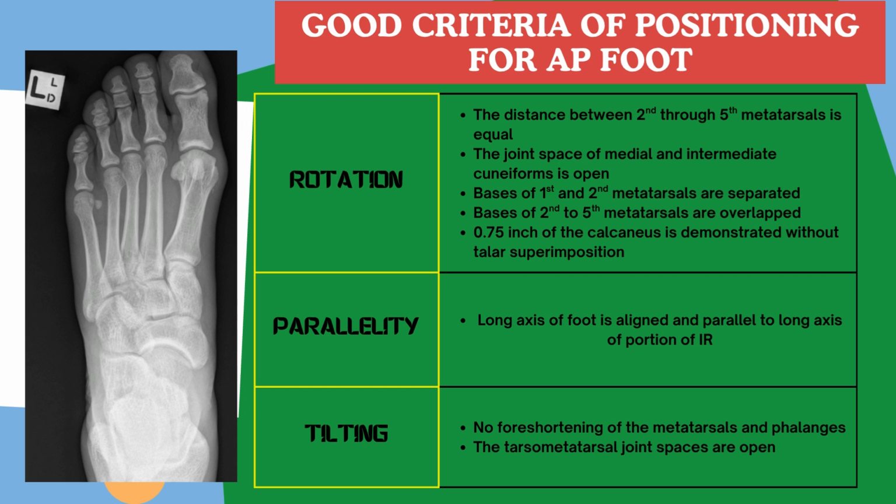The next component is parallelity. To prove the radiograph is parallel with the IR, we need to make sure long axis of foot is aligned and parallel to long axis of portion of IR.